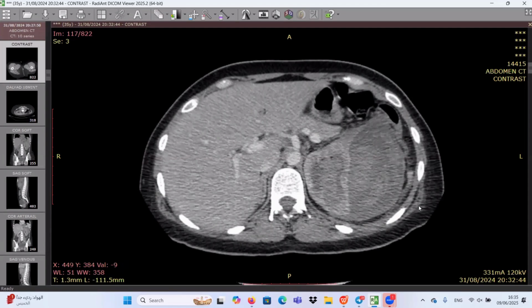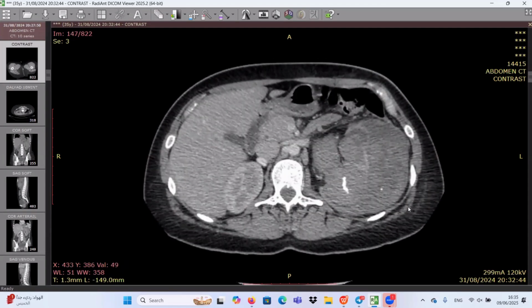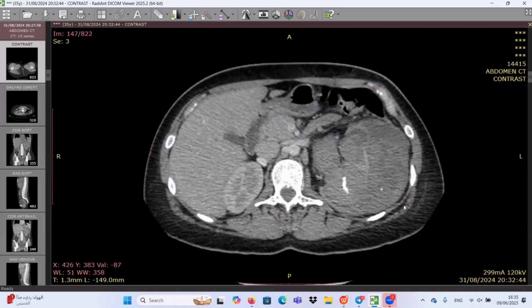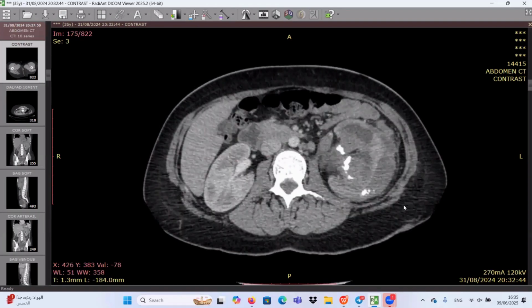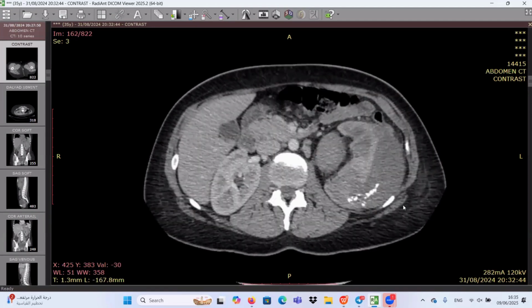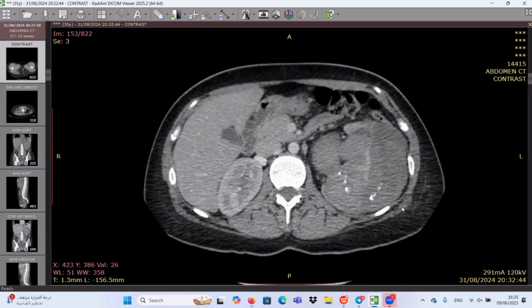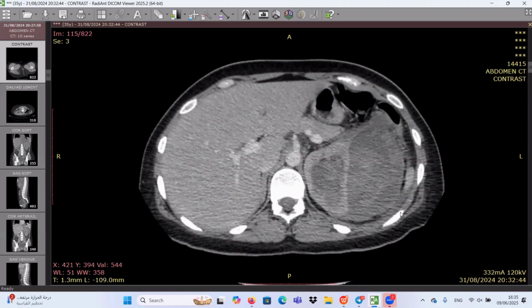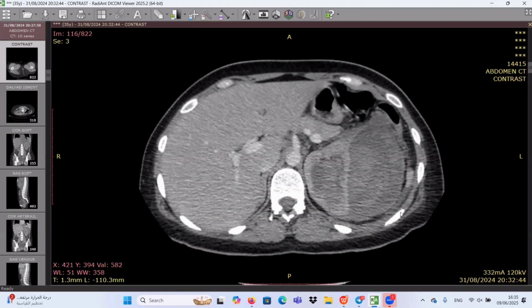Renal hilum once again, because I'm concerned about that dilated structure near the renal hilum. It's likely a dilated renal pelvis with some calcific density in it as well. So I agree with you. This one is distended with a hyperdense element, looks like a blood clot. Where is the renal contour? You said that we have an irregular one.